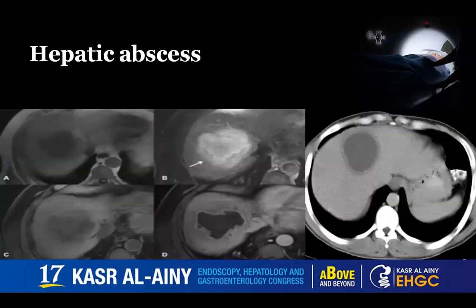This is the enhancing hepatic radicle, portal radicle. Hepatic abscess shows a well-defined thick-walled lesion. It shows peripheral or marginal enhancement in post-contrast study with restricted diffusion in diffusion-weighted images.